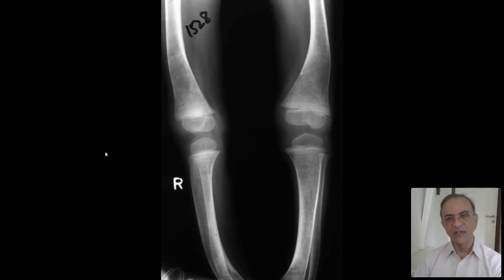You see varus angulation of the femurs and you see varus angulation of the tibia. If you see that at any age, bilateral, symmetrical — symmetrical means bilateral, okay — symmetrical varus angulation of both the femur and the tibia, close your eyes and say, this is Rickets.